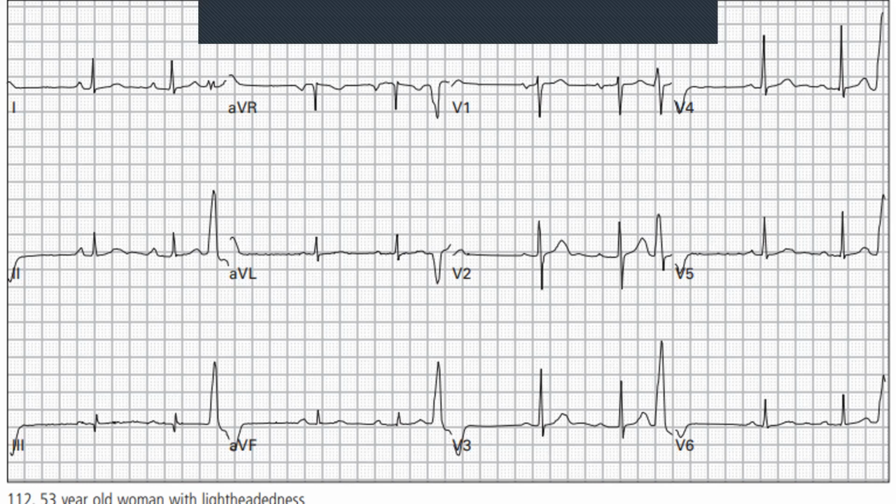Are you scared? Scary, isn't it? It's scary because if you look at the ECG just in total, it's a scary ECG. So break it down into little parts. That's the easiest way to analyze the ECG. Don't try and find a diagnosis immediately, because as soon as you try and find a diagnosis, the first thing you'll do is get it wrong. Seriously, you'll get it wrong because immediately you start looking at the wrong thing.